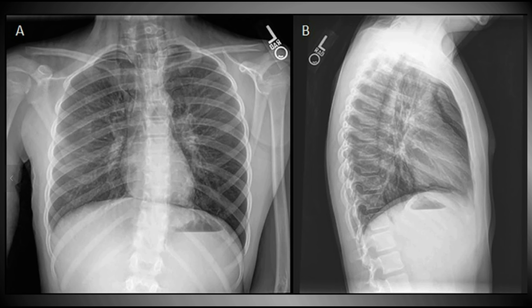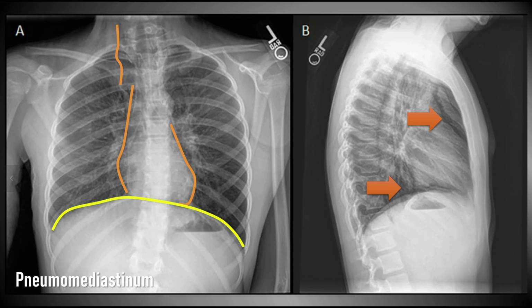The signs on chest x-ray are evidence of mediastinal emphysema, meaning that the various components of the mediastinum are outlined with black lines, for example, the heart and great vessels. There is radiolucency around them. There is also a continuous diaphragm sign where there is separation of the diaphragm from the heart. Sometimes there are rings around the arteries caused by air, but it's not apparent in this picture.